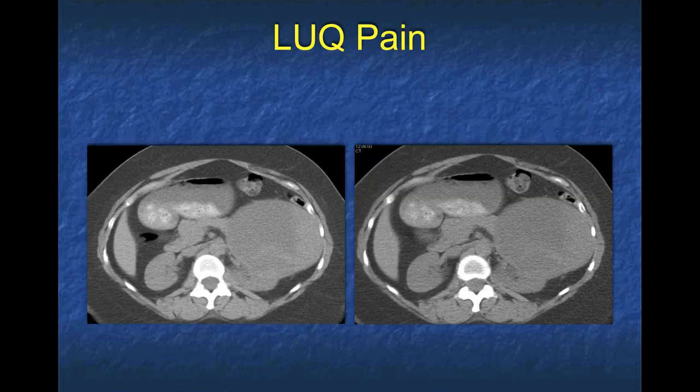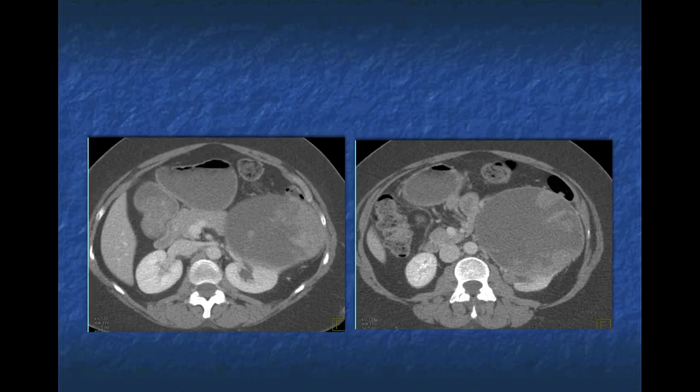Now, I was quizzing one of our faculty members yesterday, Atif Zahir, who's outstanding, and I showed him this case after I showed him those MEST tumors. And you look at this non-contrast as a big renal lesion. It has more soft tissue component than the prior study. And he was making the point very much that I would agree with. This looks like a cystic renal cell.